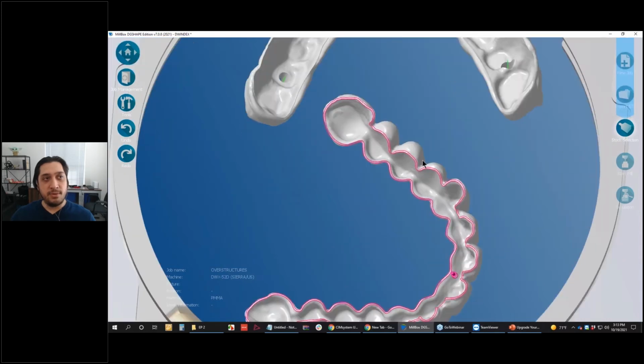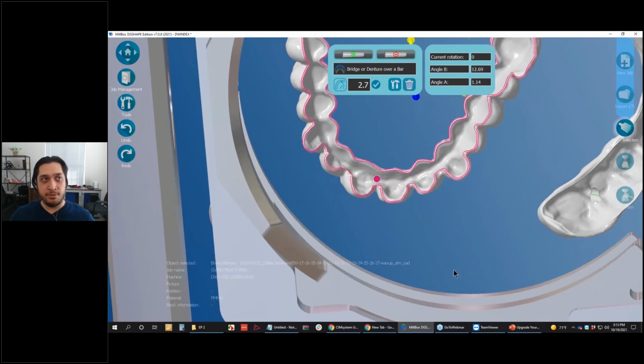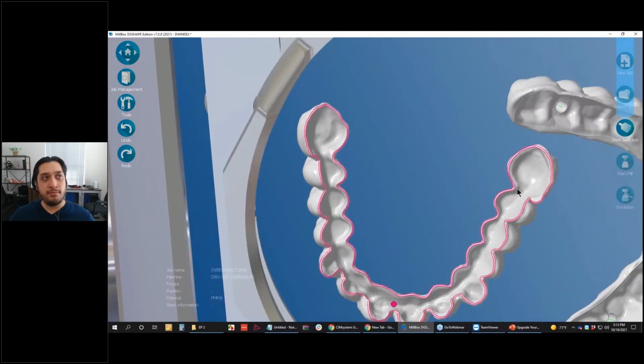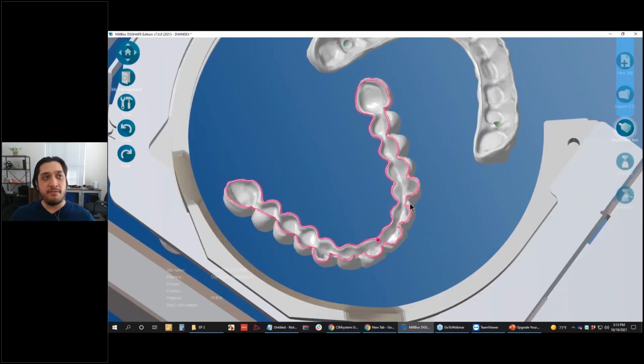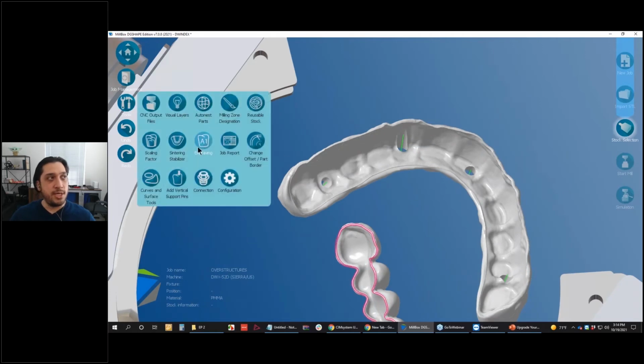That's the reason why these curves have to be present, because that's what we essentially use to make that determination of insertion. When I click on this bridge over here, you can click on that actual axis right here, and you can see it'll align according to the path of draw for this particular overstructure. If I needed to make changes, I certainly could, but ideally you want to have that information straight from the CAD, so you don't have to make any changes there.